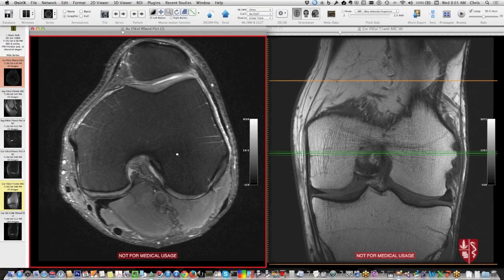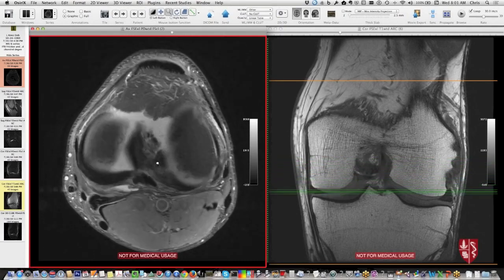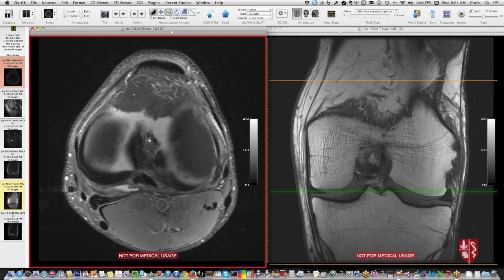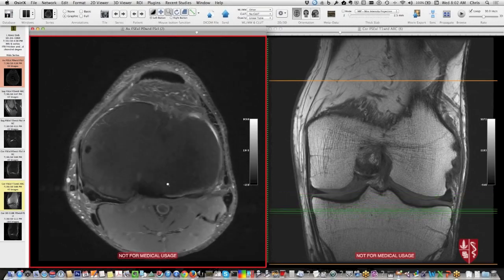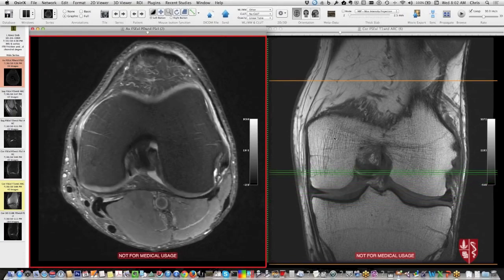So you've got to use all three planes to reinforce and refine and grade what you think about ACL tears. So ACL from here all the way down to this foot plate here, and see it fanning out. The PCL is actually nicely seen here as well. So here's the PCL posteriorly, it should be a thick black band, an ovoid structure attaching on the tibia, and then here's the horizontal part of it here.